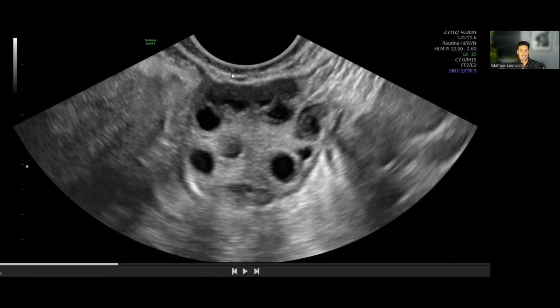Now, that doesn't mean this patient has polycystic ovarian syndrome. It just means that they have an ovary with a polycystic ovarian morphology. They also require several other criteria to meet the ultimate diagnosis of polycystic ovarian syndrome, PCOS or PCOS, as it's called in some other places, including potentially cycles that come far apart, including biochemical or phenotypical signs of hyperandrogenism, typically hirsutism and or acne.